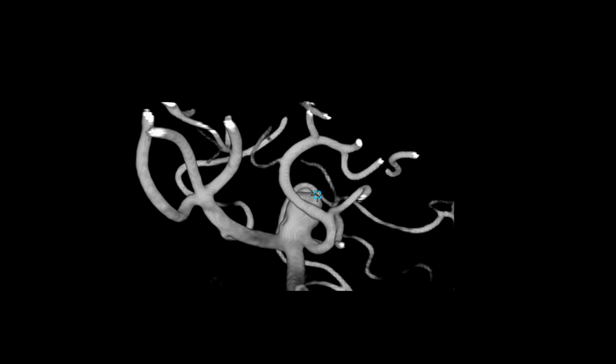Choosing the right web sizing method is crucial, but how we measure the aneurysm is just as important. In fact, variations in measurement techniques may be the leading cause of inter-observer discrepancies. This highlights the need for a standardized approach to aneurysm measurement to ensure the selection of the largest safe device size while minimizing thromboembolic risks.